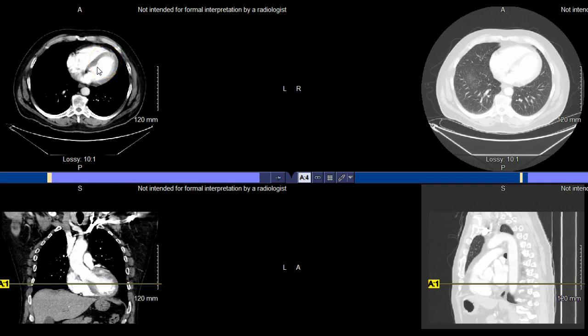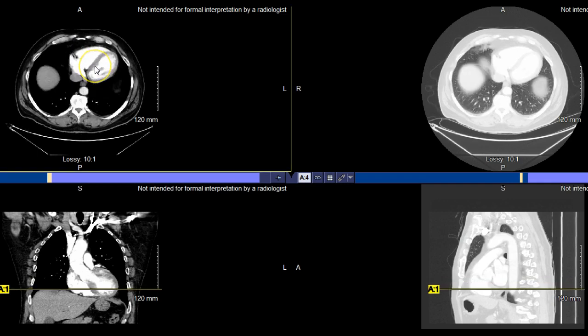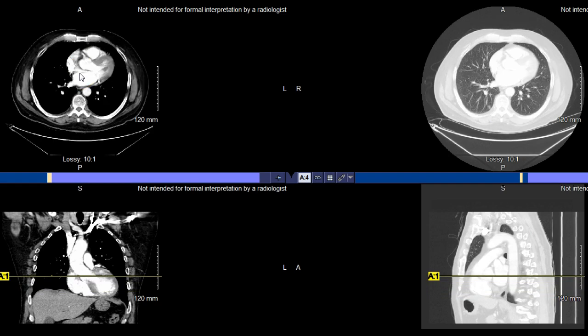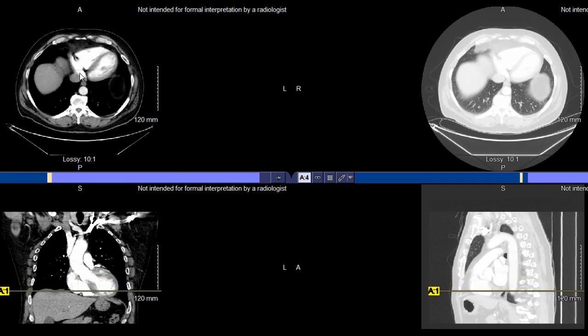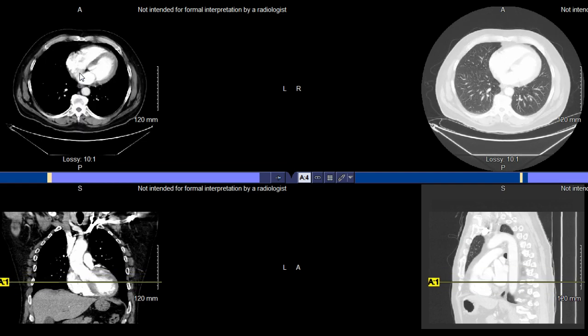As we go more inferior, you can see that interventricular septum that we've mentioned before. So you can say, all right, here is the left ventricle versus here is the right ventricle. So we can see those structures pretty clear there respectively. So I think, like I said before in the tutorial videos, looking at a static image doesn't give us that true understanding of the sectional anatomy unless we look at it live in this regard. So you can see those points of connection there respectively.